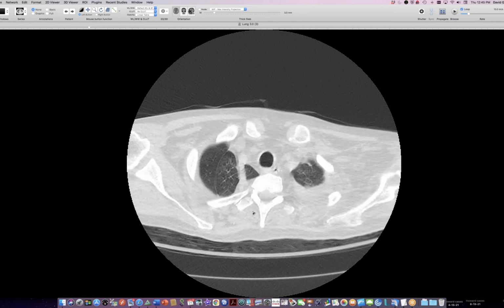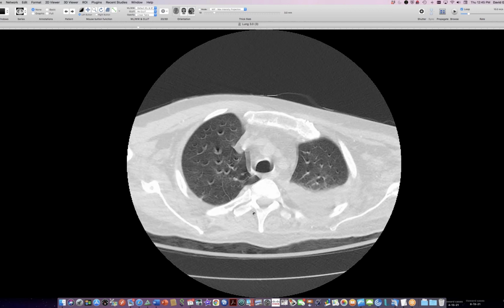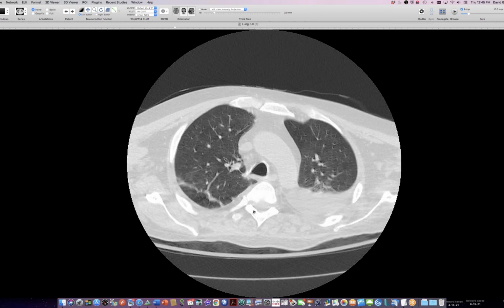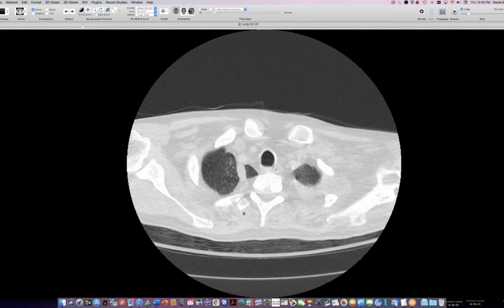Now, this is an outside patient, and this is all outside imaging. This man has a complicated history. He's got chronic renal failure. He's got other problems too. Don't have any surgical history on him to know whether he ever had a pneumothorax or a pleural effusion. He could have had lung collapse, and then when the lung re-expanded, the little thumb part of the azygos lobe didn't end up going back where it should, and it got caught.